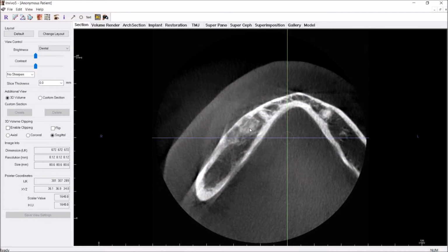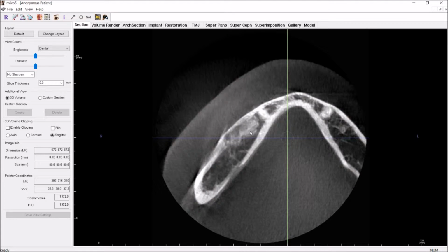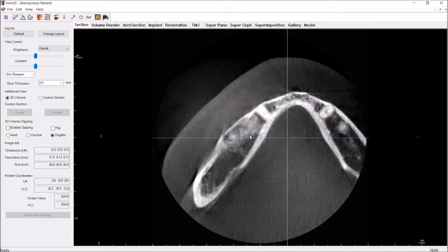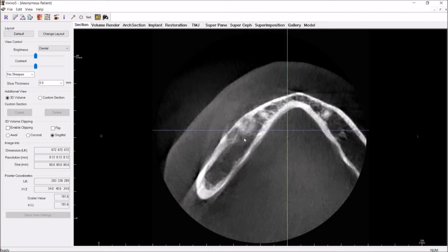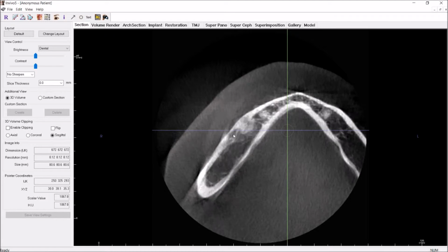And so you describe the appearance of that, and you want to call this a little cloud shape or little wispy hyperdensities. I wouldn't really call it ground glass. Maybe it's more like some cotton wool, or just kind of an amorphous mixed appearance. And is it more hyperdense in the center or around? The anterior part of it is kind of more mixed throughout. This part looks a little bit more hypodense.